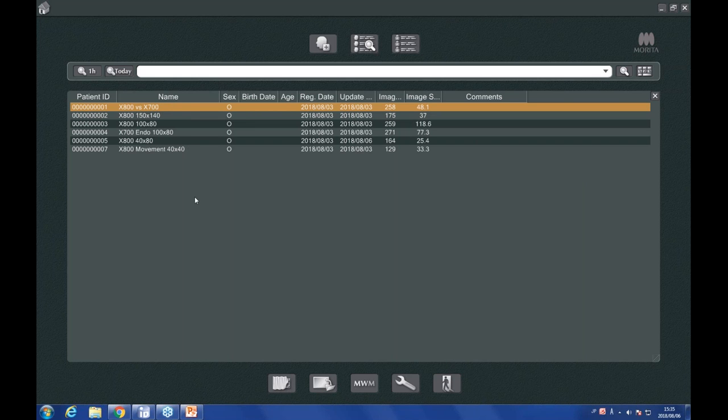So definitely not what you're going to see in an actual practice, but nonetheless, for illustration purposes, this will be enough. Now, when we are going to search for patient data, we can, of course, search here in this bar at the top, either by patient ID, if you're dealing with, say, for example, a medical ID, or, of course, by the patient's name.